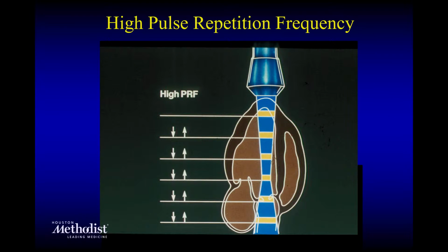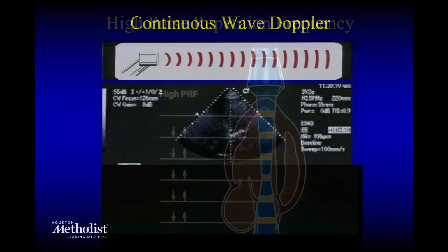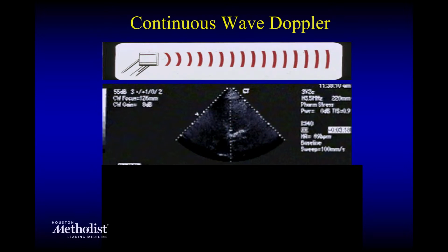High PRF, or high pulse repetition frequency, is where at times you can fool the system if you want to interrogate. We used this much in the earlier days of trying to interrogate, let's say, a mitral regurgitation jet or an aortic stenosis jet, where we had problems with getting these by CW per se, so the direction. So you increase the frequency closer to your area here, and because of that much higher pulse repetition frequency, I will be able to record the jet without much aliasing if it is further away. So I'm tricking the system in a way to get almost to a continuous wave Doppler.